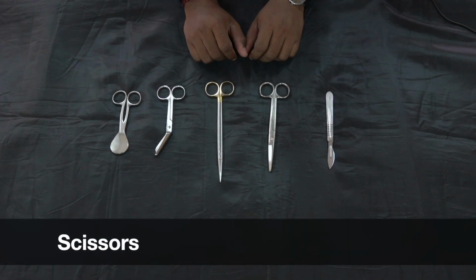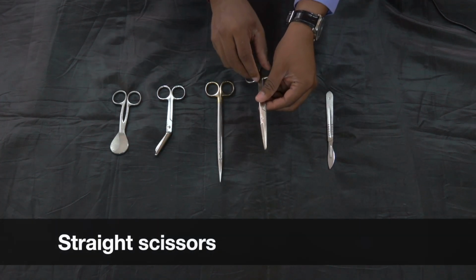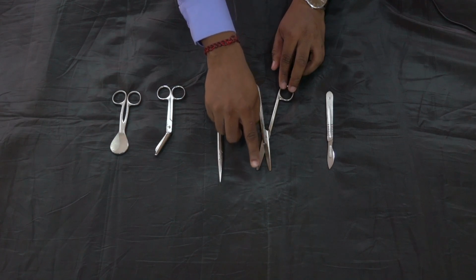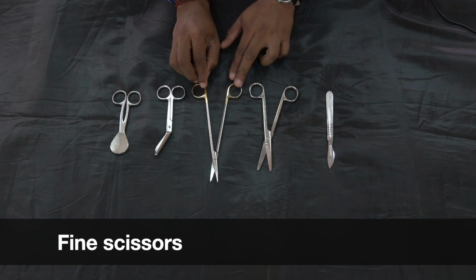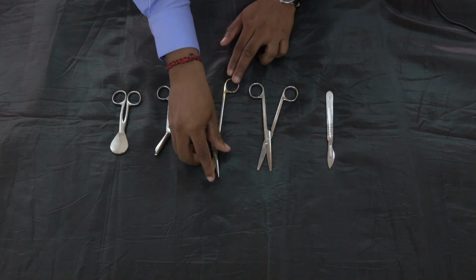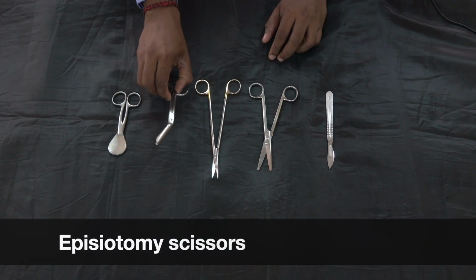The second is scissors. In gynecology and obstetric surgery, we use different types of scissors in shapes and sizes. This is a straight scissors which has a handle, shaft and the blade, and the tip is blunt. This is another type of scissors which has a handle, straight shaft, and the blades are curved and the tip is sharp. This is called fine scissors. It is called episiotomy scissors.